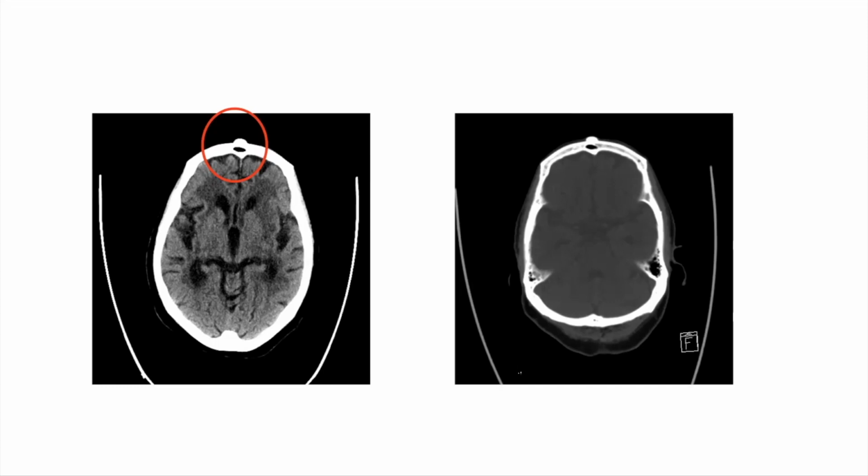Okay, so we have some takers for osteoma and intradiploic epidermoid. So let's take a look at that.